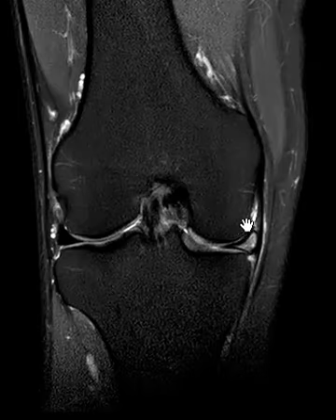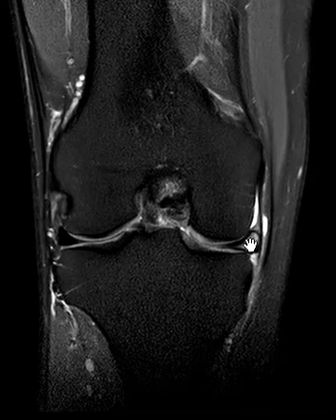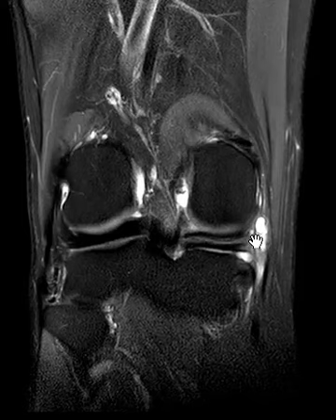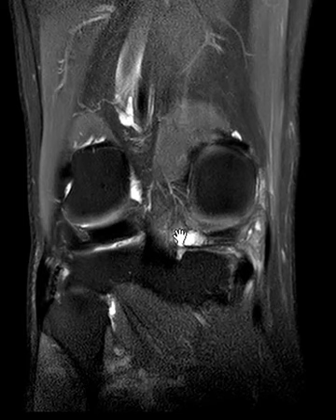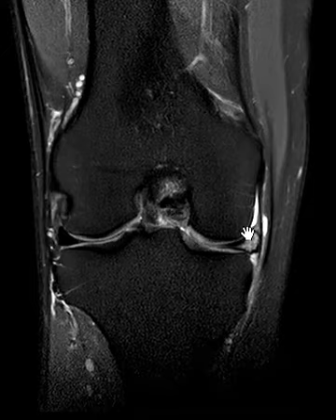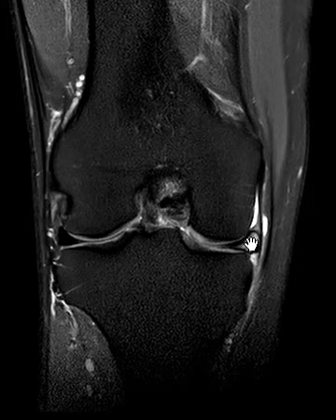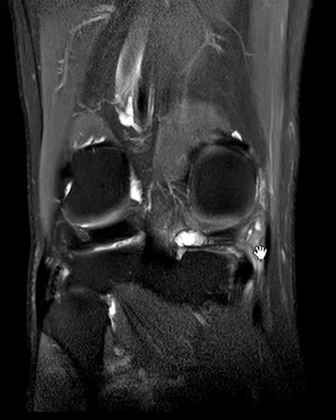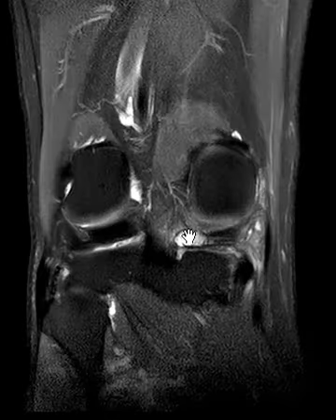So this is a meniscal cyst expanding the meniscus, and then along the outside a parameniscal cyst, that some of this material is spilled outside. Here's another little parameniscal cyst. So that's it. So there's no articular surface tear that touches the top or bottom, just a meniscal cyst that's expanding it, and parameniscal cysts along the side and back of the meniscus.